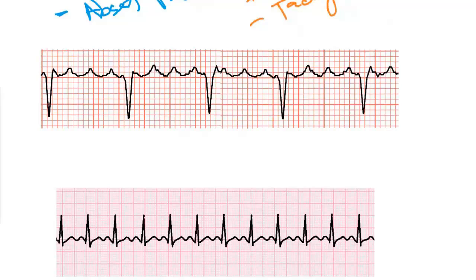Next, what kind of pattern do you see in this EKG? This is an example of a sawtooth. Okay, so there is an abnormal cardiac rhythm of sawtooth appearance where there is a rapid regular atrial depolarization of more than 300 beats per minute. And similar to atrial fibrillation, this is atrial flutter.